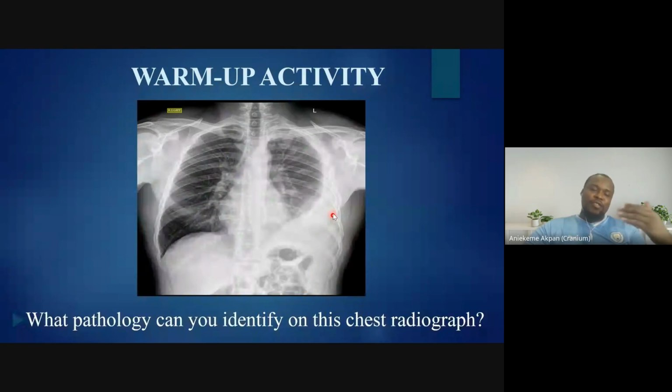If you see the way the cardiologist, in front of me, analyzed this chest X-ray, the man was saying that the inspiratory effort is poor. So because the inspiratory effort is poor, it may falsify the cardiomegaly. It may make the heart look bigger, because he was telling me that the heart is sitting on the diaphragm. That to them, if the heart is standing and is still greater than 50%, that's when they can even consider cardiomegaly. And he also told me that even this cardiomegaly sometimes may not really mean anything.